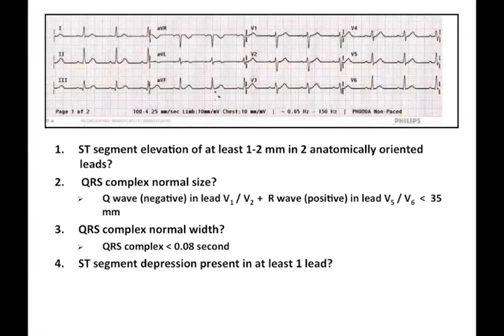Here's a 12-lead electrocardiogram of a CARS member. This CARS member looks well, isn't having a heart attack, okay? Might be slightly crazy like most of us, but is not having any cardiovascular problems.